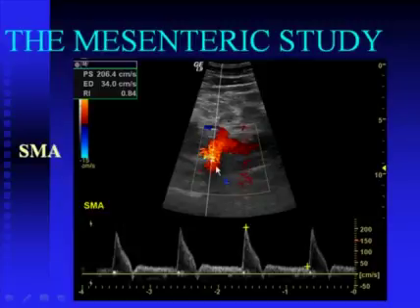The superior mesenteric artery, on the other hand, if the patient truly is in a fasting state, tends to be a high resistance waveform where you see a very sharp systolic peak with a good systolic upstroke, but minimal end diastolic flow. If you have experience doing carotid duplex ultrasound, you can actually equate the celiac trunk to the internal carotid artery of the abdomen and the fasting superior mesenteric artery to the external carotid artery of the abdomen.